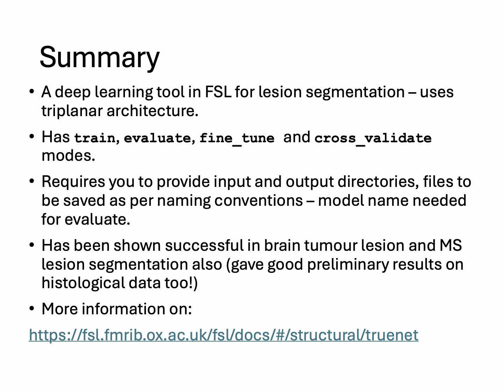It has various subroutines to enable various functions, including training the model from scratch, evaluating an already pre-trained model, or fine-tuning a model to adapt to the new dataset. And finally we have the cross-validate option, which directly does cross-validation without you having to do the training and evaluation separately. You can do so with the train and evaluate functions, but we have done it implicitly in cross-validate.